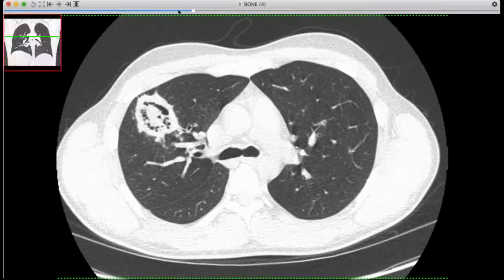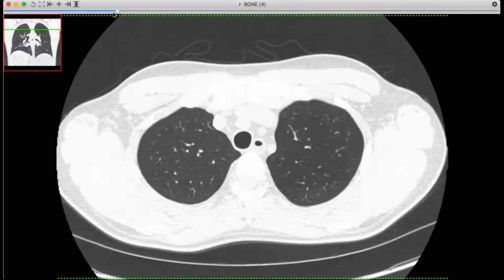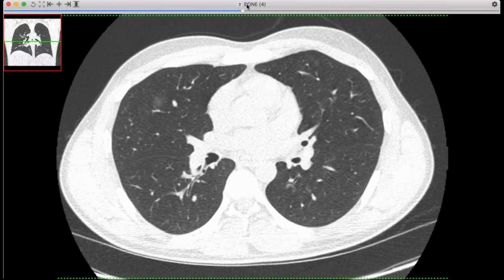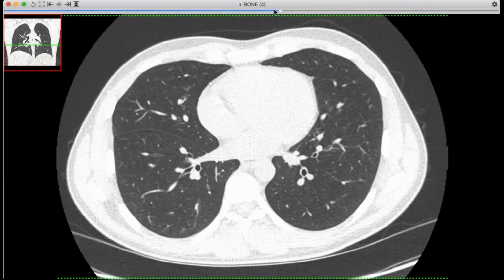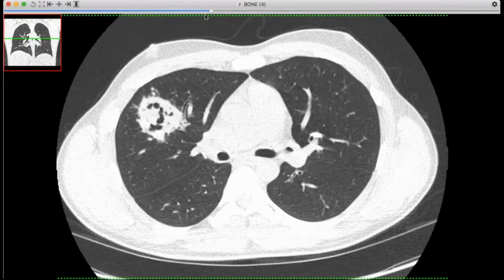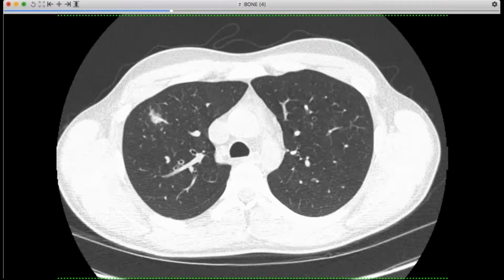And his airway was nice and smooth, right? No airway. Yeah, he did not have airway involvement, which is interesting. I used to see a lot more of that, and I don't see a lot of GPA anymore, but of the few cases we see a year, I've not seen nearly as many cases with airway disease. So I don't know why that is, or if it's just a sampling error of a smaller number of cases. Okay, this next case might be chronicity.